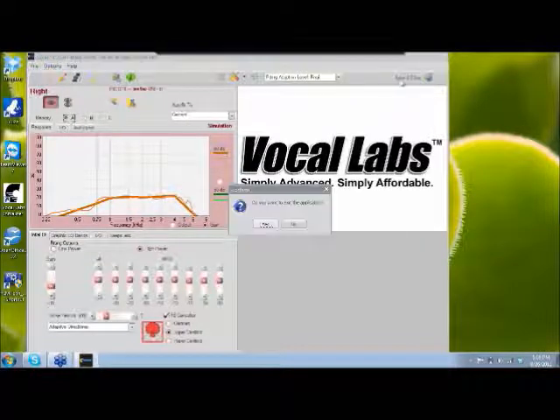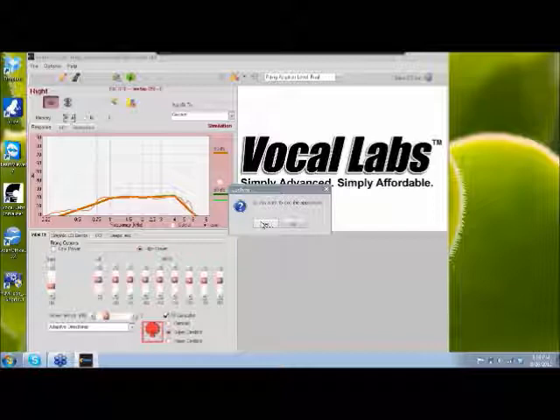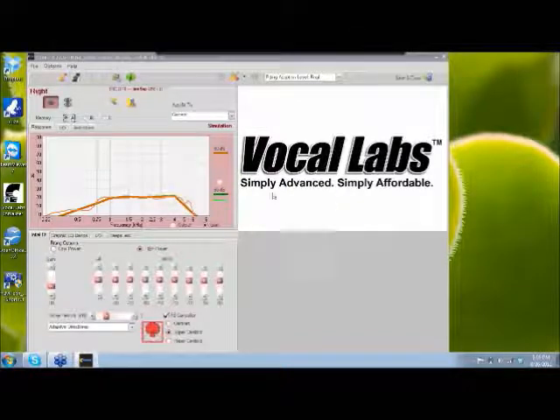So if I click Save and Close, it saves my session. Since I do not have a hearing aid hooked up, it did not ask me if I want to program, but before this pops up, if you do have something hooked up, it will say, do you want to program the device? Just say yes there. At that point, you can unhook the aid, and it will keep anything that you have put in. If I want to exit, I'm going to say no.